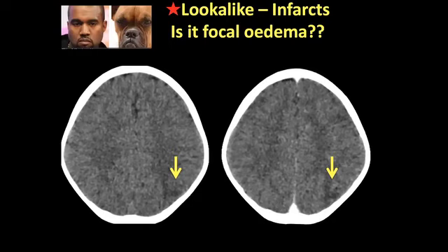So just one thing as a caution, when we have something that looks like a focal infarct, sometimes we just don't see it. We have a high incidence of infections in our country, and yet still, sometimes we just don't know. So this is a patient who had focal edema, presented with focal seizures, had a Todd's paresis afterwards. There was some concern about whether they should do a lumbar puncture. We saw this focal edema.